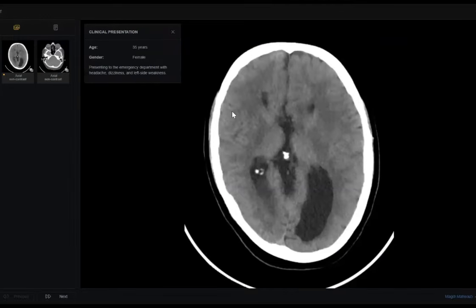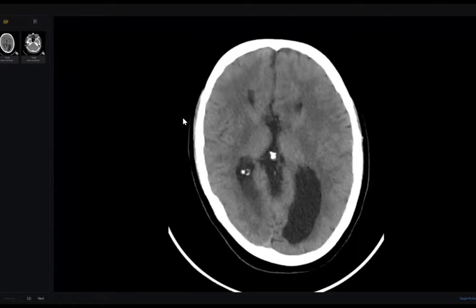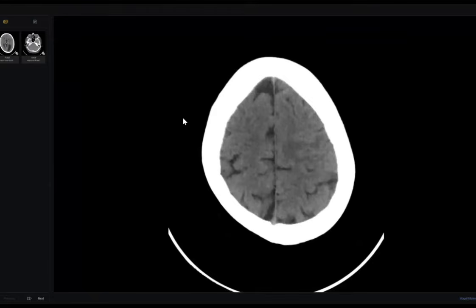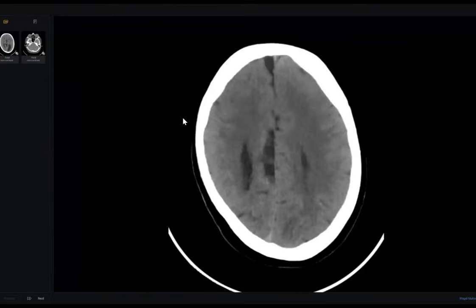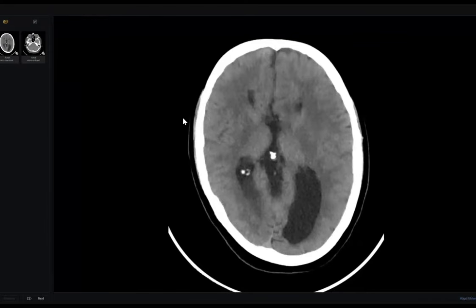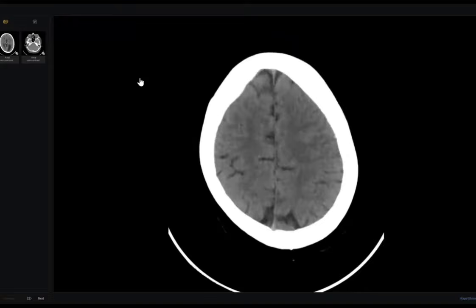Hello? Yes, here with you, doctor. This is a 35-year-old female patient presented to the emergency department with headache, dizziness, and left-sided weakness. Can you scroll, doctor, or shall I scroll for you? No, scroll for me, please, because I'm on the phone. How old is the patient, please? 35 years old. Okay, thank you. Adult female patient presented to the emergency department with headache and dizziness.